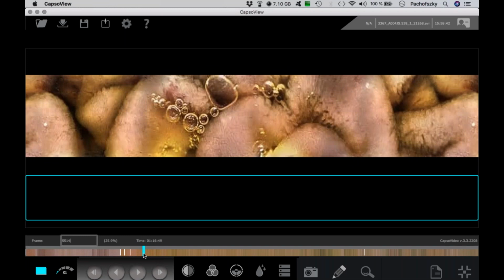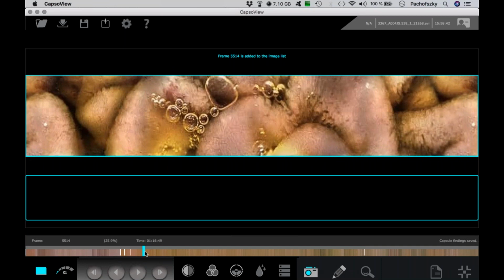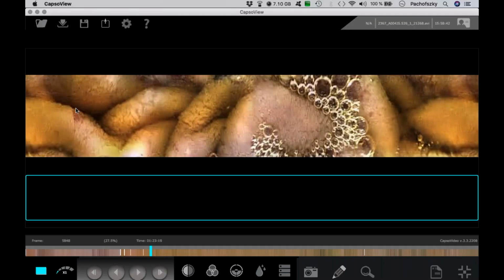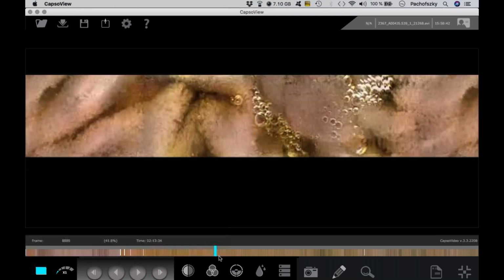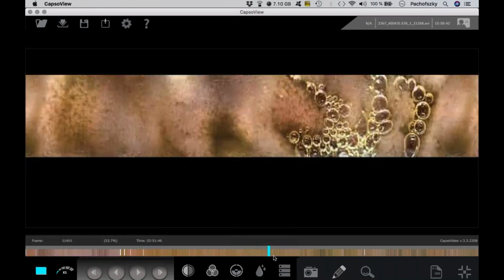And if you look at this here, only with this very quick view, you can see here is an angiodysplasia. So we can set the mark here in this area, and then you're going on, and you can see also here another one. So even with this method, you can find a lot of pathologies in your examination.